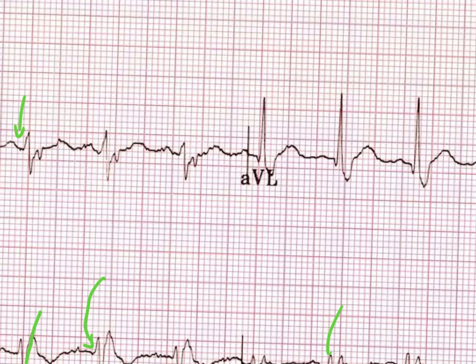All right, so where's the R wave? Going up. And then the S? Down. The little r, big S. Oh, you don't go from the center? You go from the center to the top and then the center to the bottom. Is the R wave smaller than the S wave?